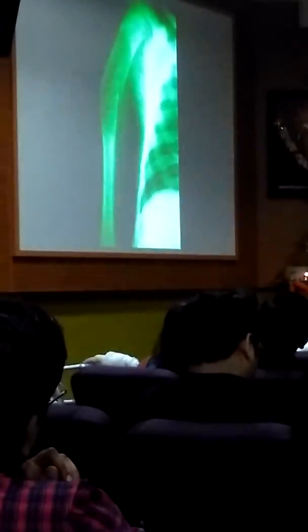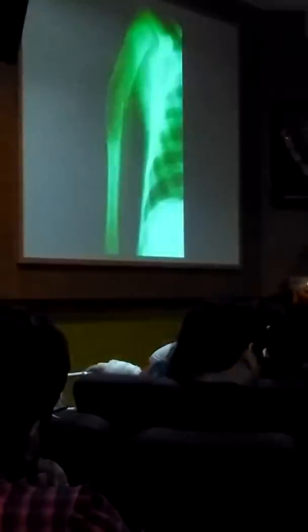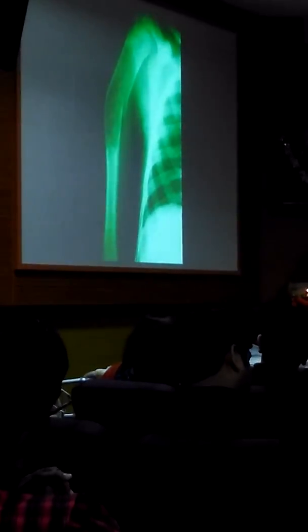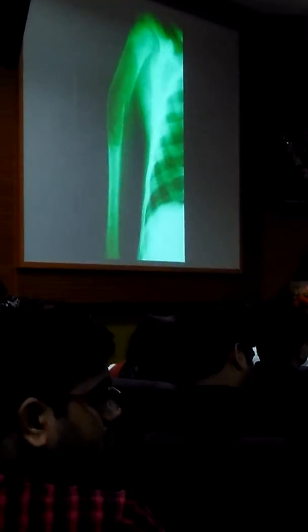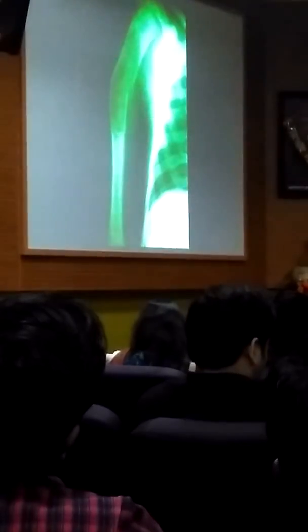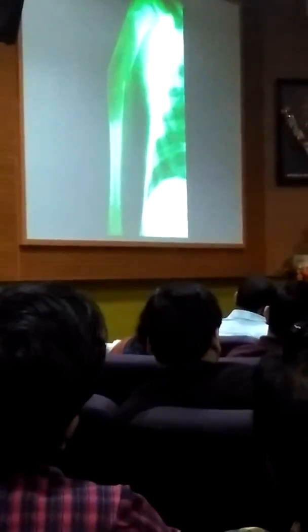The next thing which we like to see is which part of the bone it is arising from. It can arise from the epiphysis, from the metaphysis, or from the diaphysis. And all of us know that certain conditions occur in the epiphysis. So this is arising from the metaphyseal-diaphyseal region. This can be called a geographical area in the metaphyseal-diaphyseal region.